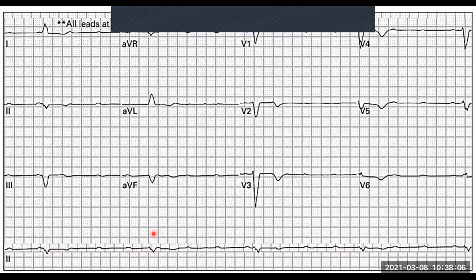And then what about the QRS complexes themselves? We know the QRSs are wide. And we had already spoken about this: when you have a wide ventricular QRS complex, it means that your impulse is coming from further down. So in this case, it's coming from quite low down. That's why you're having this wide complex everywhere, right? And then, are they regular? Now, that's an interesting question, and we're going to get back to that. It looks relatively irregular, but we'll get back to it.